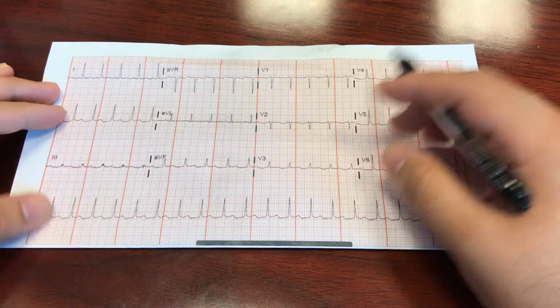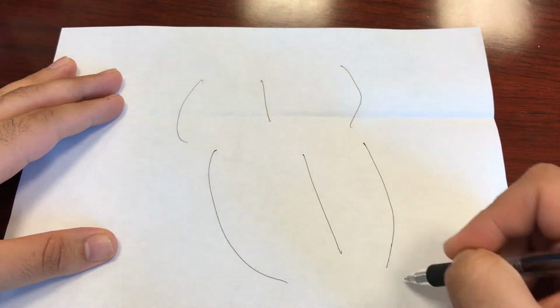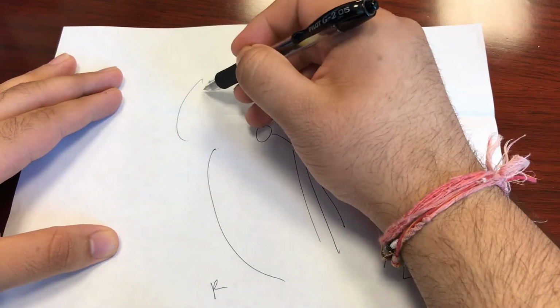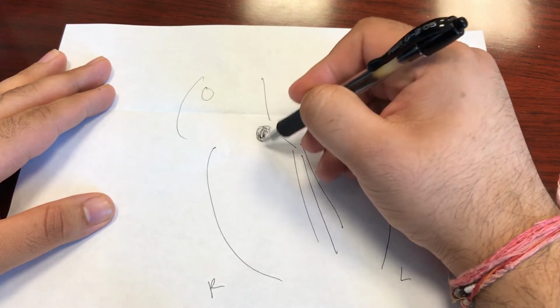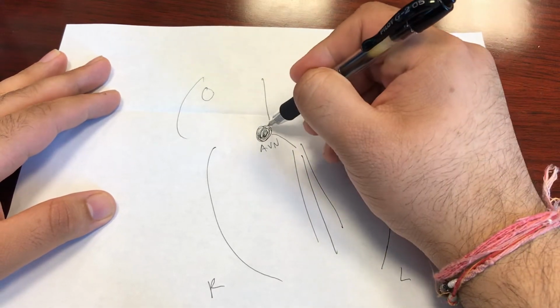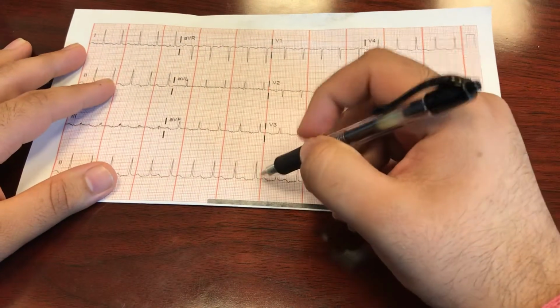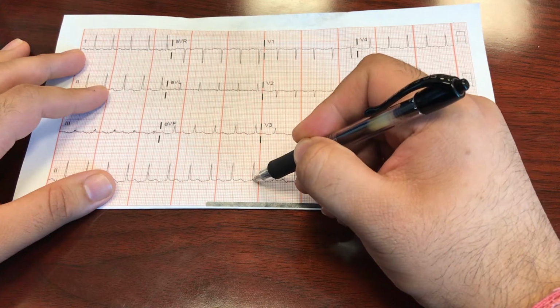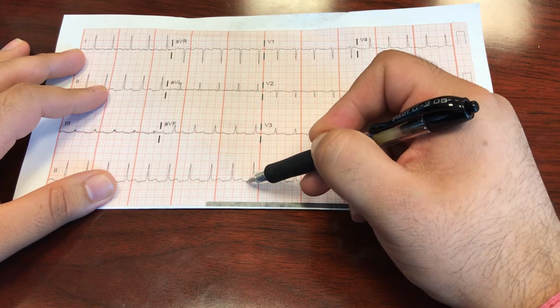Remember, when you're talking about a junctional tachycardia, what you're saying is that it's coming from the AV node. Remember, this is the left, this is the right. You've got your AV node, bundle of His, and your bundle branches, and then your SA node. So if the impulse is originating in the junction, in the AV node, then you will start off with a QRS complex, that's correct. But if you are to have a P wave, it should be hidden either within the QRS complex, immediately afterwards, inside the T wave, or maybe just before. But it shouldn't be this far late or this far early.